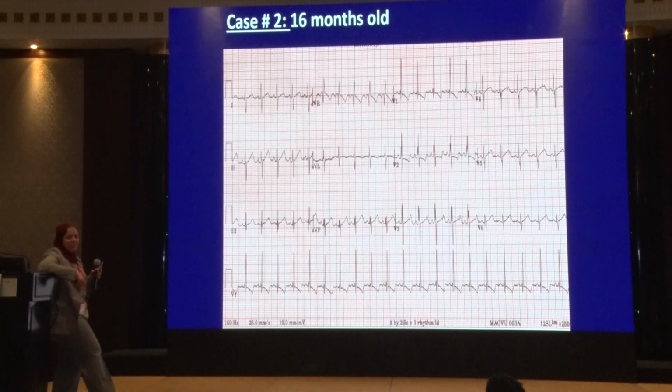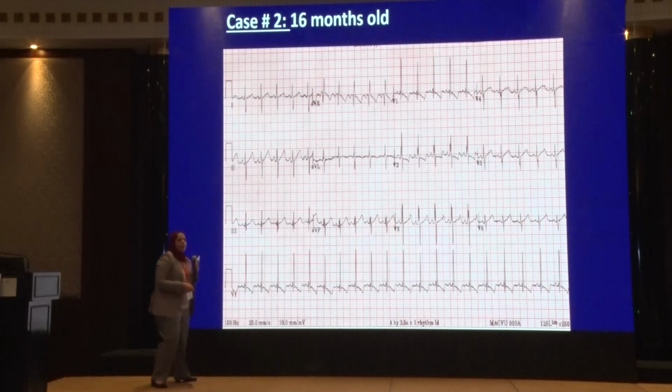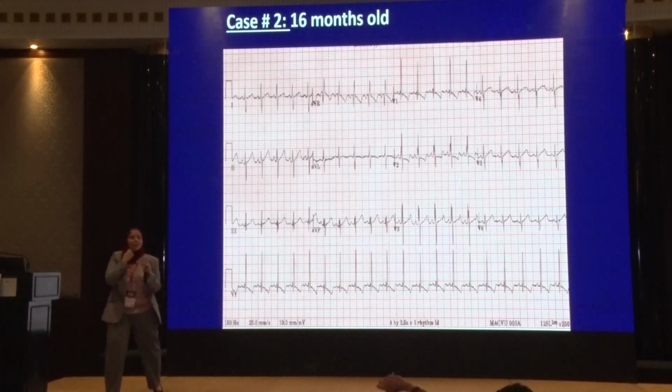Anyone finish the calculation? No, we have 20 patients. We have to go. We have to be faster. So the small squares from here to here, we will multiply it by 0.04. Then, 400, Dr. Ayman.